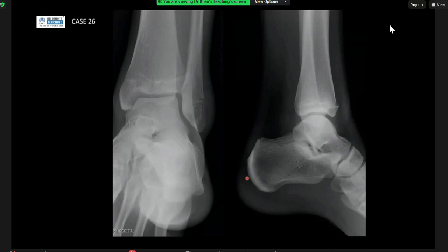Okay, next case. While running, fell over and twisted ankle.